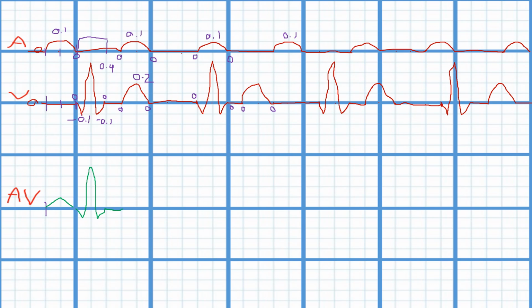All right. So now where are we at in terms of our graph? So we're up to this point right now. All right, so now we'll go one more over, and so we're at 0.1 plus 0.2. Well, what's 1 plus 2? 3, right?